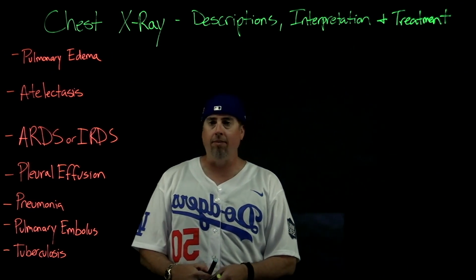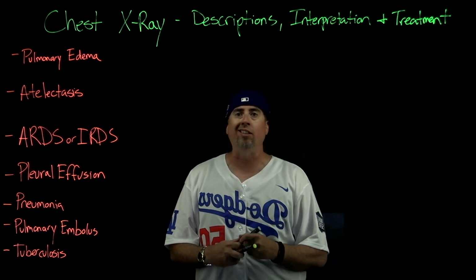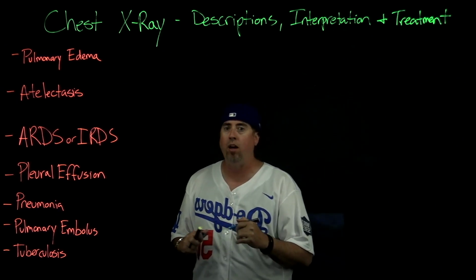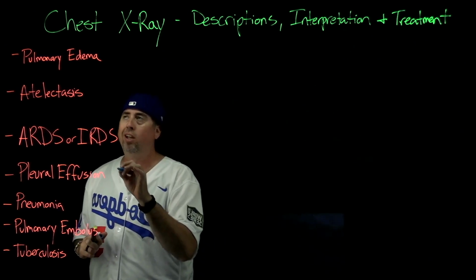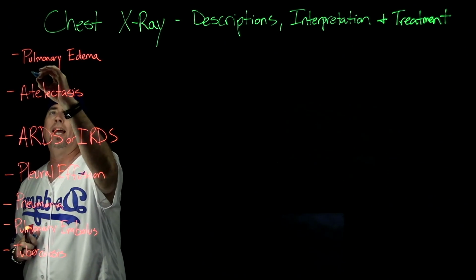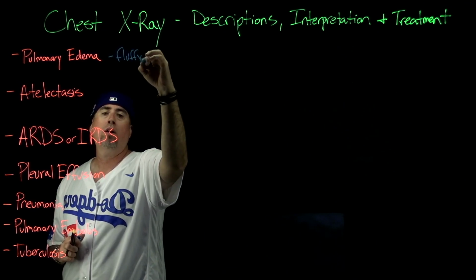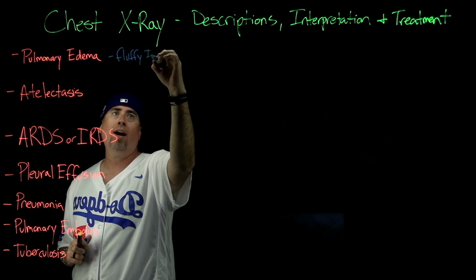So pulmonary edema, guys, we're going to see this in descriptive language. When we see this, this is what we can see: descriptive language such as fluffy infiltrates.